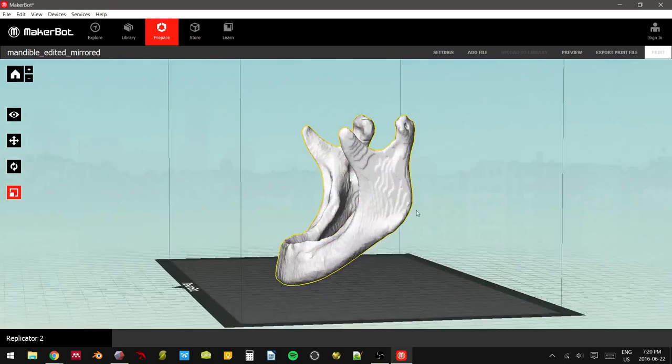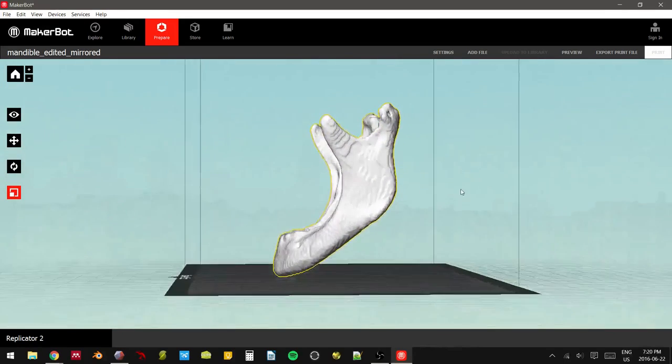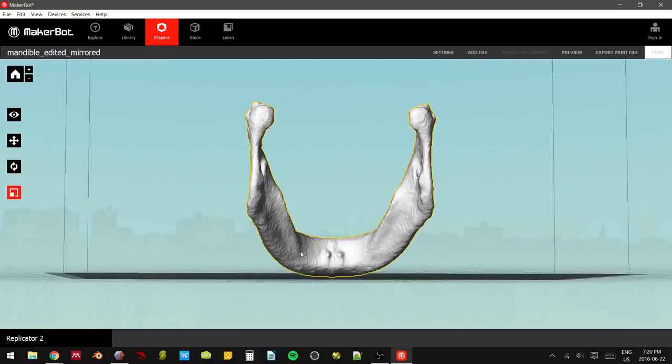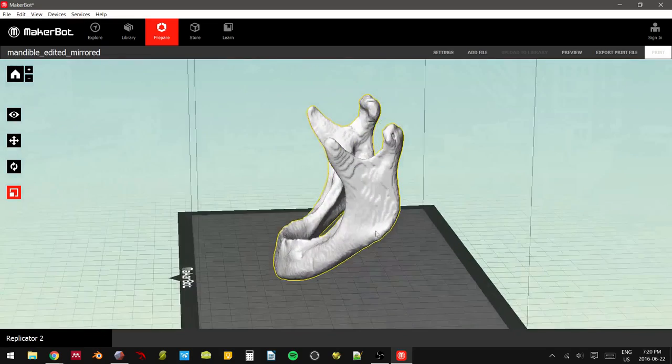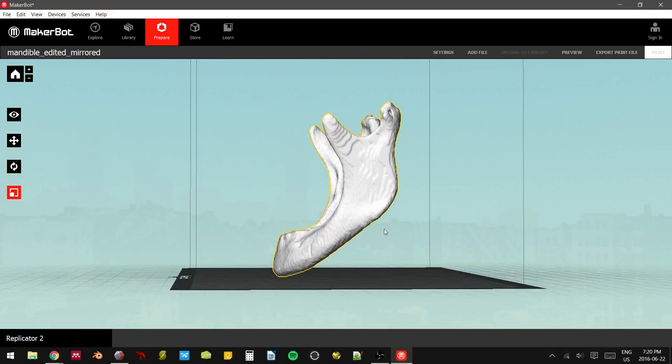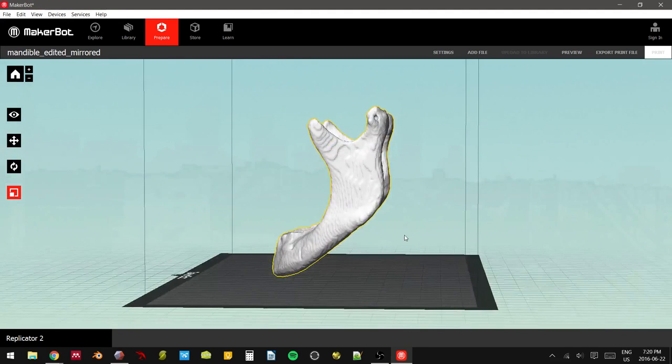Now we take a look at our model's geometry, and as you can see, a lot of it looks like it's just in midair. You can get away with angles that are less steep, but usually at about 45 degrees the cutoff becomes too steep, 45 degrees or anything higher. In cases like this, we call our models possessing severe overhang, and the printers are not going to like that because it's just going to be printing in midair, and your objects won't come out either nice looking or at all.